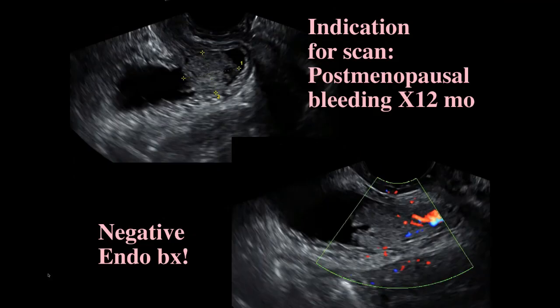Now here, this was a really amazing case, and I'll tell you about it. This was somebody who had postmenopausal bleeding for 12 months. And she went to see her doctor a number of times. The doctor did 2 endometrial biopsies that were negative, and then sent her out. And finally sent her to me to look at the endometrium.